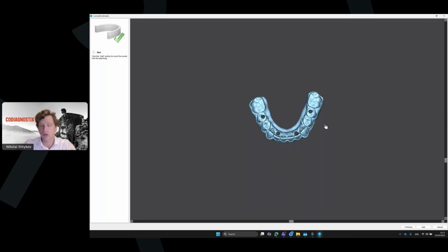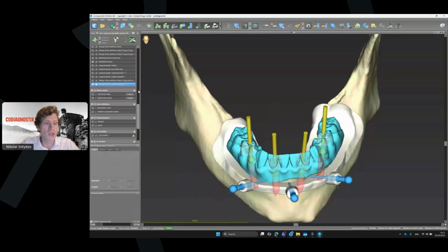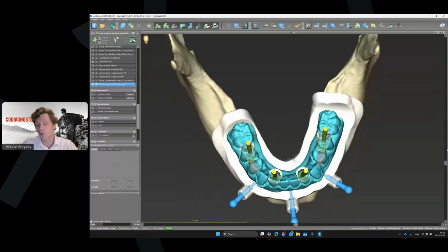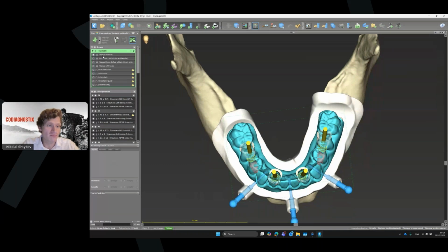Now you can use it, you can send it back to the CAD software, or it doesn't matter, you can just print it, and that's it. You can edit it in your planning. So now we have it here, wax up, no holes with analogs. You see it here. For the cage, we need one more model. It will be designed in the same way, totally the same. So I need to have the same model with no holes, or the model as I just created.